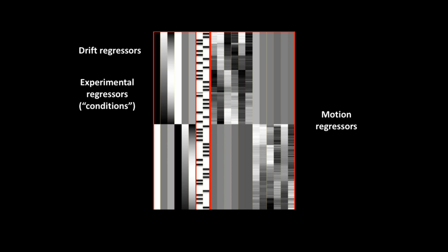This might be dumb. Are there 6 drift regressors because they go to the 6th power? In this case, let me think here. I know that, yeah, these definitely model, say, baseline, linear, quadratic. It's the first time I really looked at this, so I don't know what these 3 things mean, actually. That's a good question, yeah, because it makes sense to include, say, 3 to the 3rd power. It's the same thing, right, but they're flipped. If you look at the ones from the bottom, the second, gone to the top.